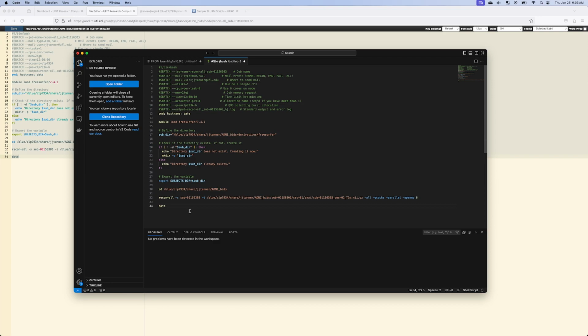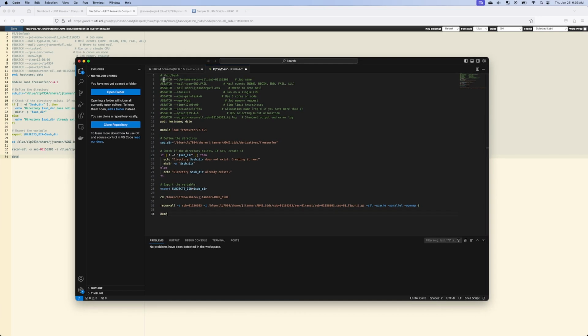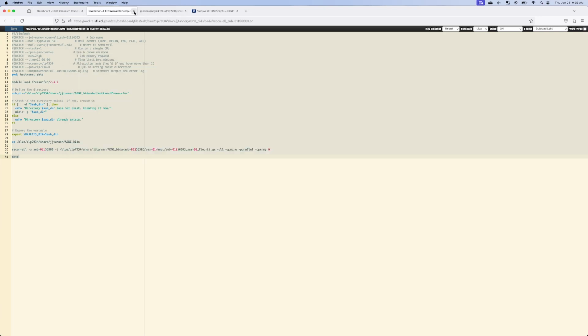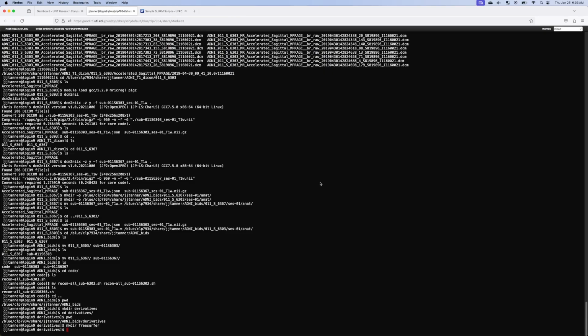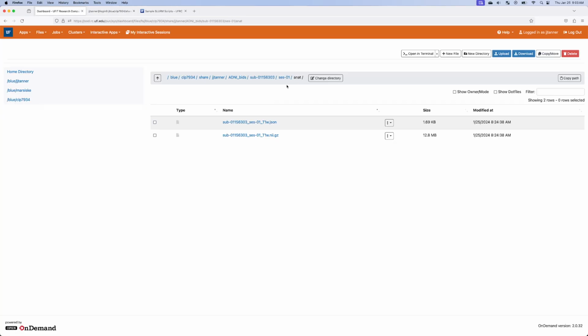So I have it somewhere else, and I should save this early, but we'll see if this actually saved or not. So I'm going to close this, and we'll see if it saved or not. It might not have saved.